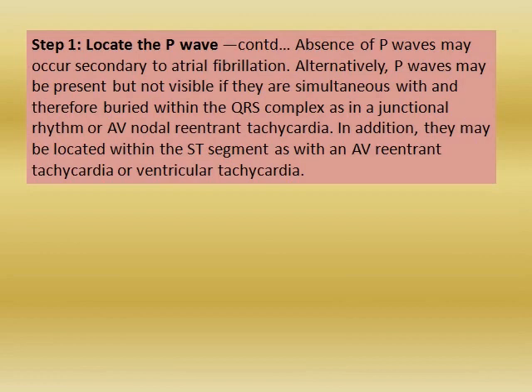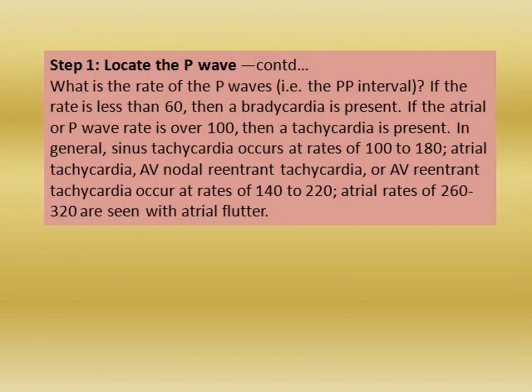In addition, the P wave may be located within the ST segment, as with an AV reentrant tachycardia or ventricular tachycardia. What is the rate of the P wave? That's what we have to look for. Or what is the P interval?